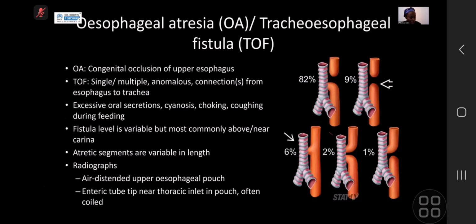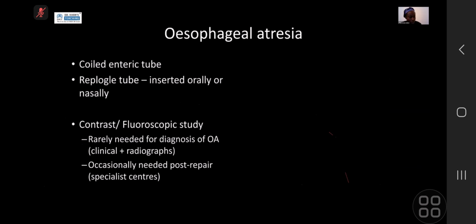So we've looked at the radiographic findings already, so I won't repeat them because I think I've said them many times already. So we've seen the enteric tubes.